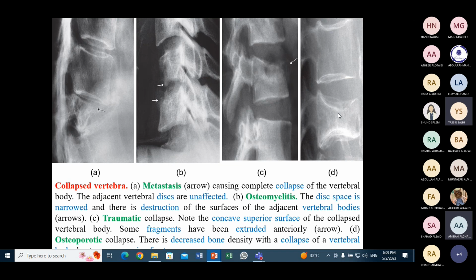This is the small vertebral body. هو شيء نحن لازم تلقاه small وتيجي تشوف other sign. ف if you look to the general density of the spine, لاحظ انه the density of the spine is reduced. So there is a generalized decreased bone density with concavity of superior and inferior, this disk spaces. So this is شنو osteoporosis. In osteoporosis بيكون شنو there is a generalized decreased bone density with a small vertebra.